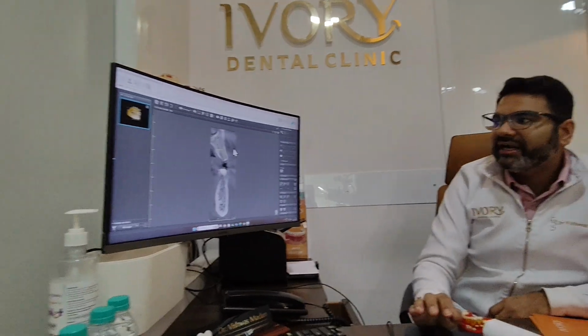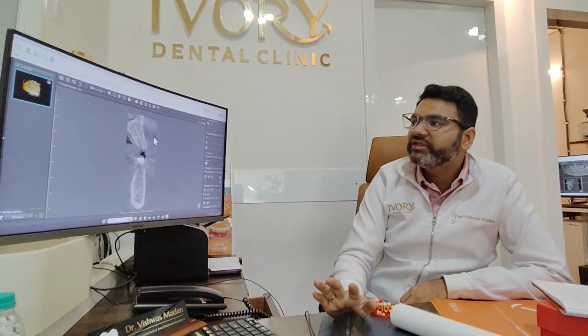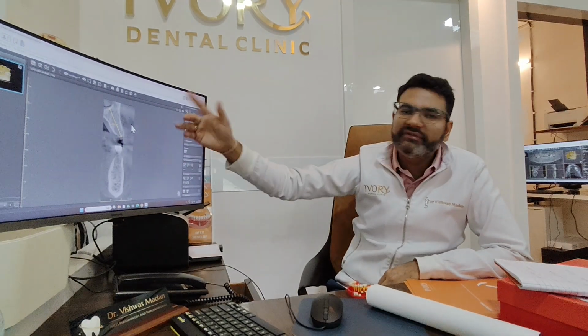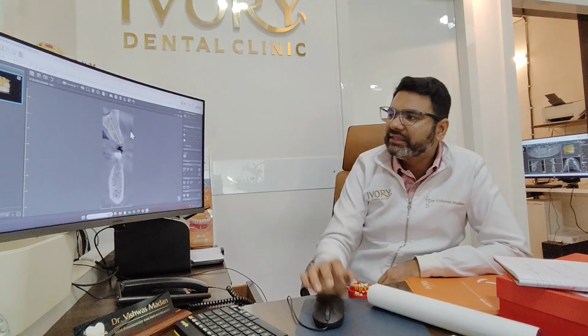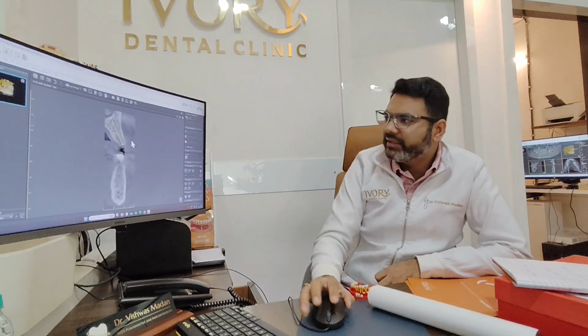But we have to stay away from the anatomic landmark by around 1.5 to 2 mm. So if it's a nerve, we'll subtract 2 mm from this. But if it's a sinus, we don't need to subtract, because we can go till the sinus. Okay? If it's a nasal cortex, we know. So 24 mm is a huge bone in this case.